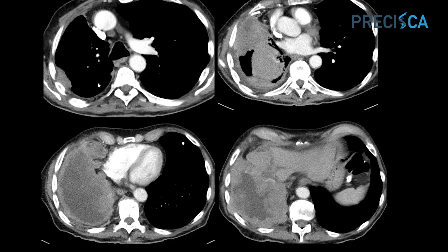The other is to look at this. This is the subpleural fat. The subpleural fat is the fat on the outside of the parietal pleura, between the innermost intercostal fascia and the parietal pleura itself. It should be really clean. It should be nice and black, just like the subcutaneous fat here. If you notice, there are nodules, and the nodules are almost like stalactites. They're kind of embedding into this subpleural fat. Here you can even see there's a nodule that goes between the ribs. When you see that, that is almost always a malignancy.